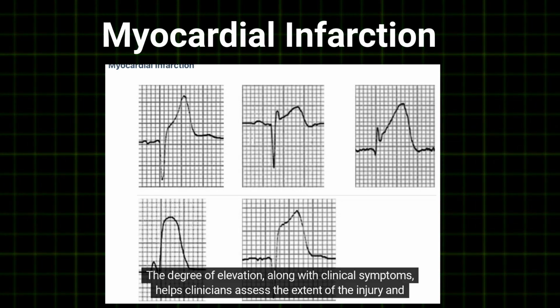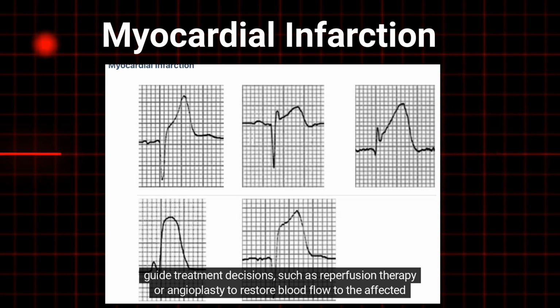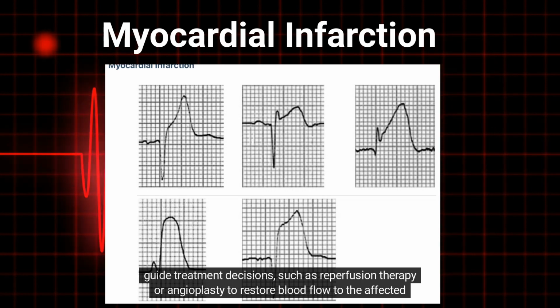The degree of elevation, along with clinical symptoms, helps clinicians assess the extent of the injury and guide treatment decisions, such as reperfusion therapy or angioplasty, to restore blood flow to the affected area of the heart.